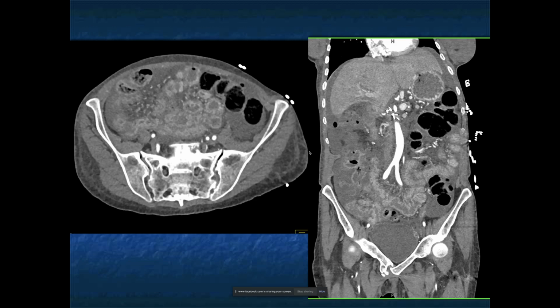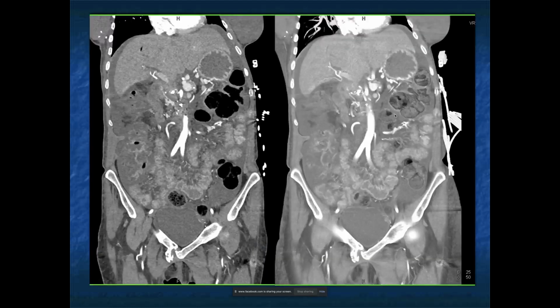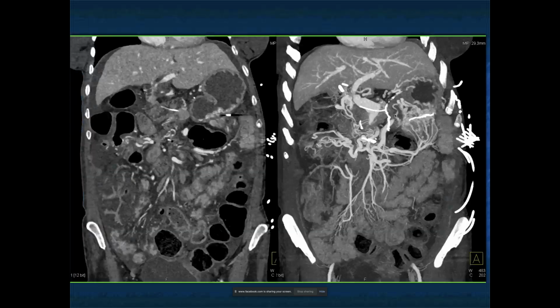The patient also has ascites. You can see some clips here. This patient had pancreatic cancer by history and had it resected previously. So what are we dealing with? You could be thinking about pseudomembranous colitis, patients who've been in the hospital, patients on antibiotics, they get pseudomembranous colitis. It can be right-sided only, it could be cecal only, it could be a pancolitis.